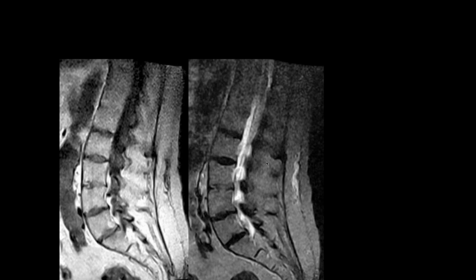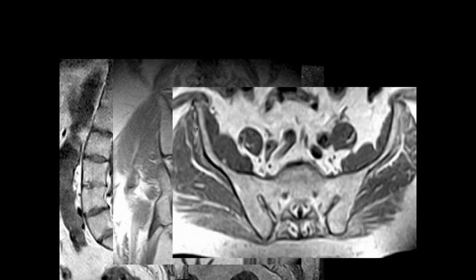This is someone with long-standing ankylosing spondylitis and also fusions of the facet joints back here in the posterior elements as well. The coronal images show fusion of the SI joints on both sides and a hip replacement on the left. So this patient was very stiff. Not a good yoga candidate.